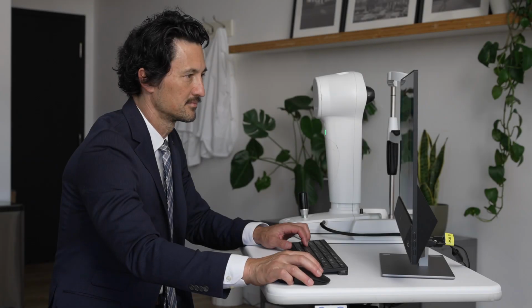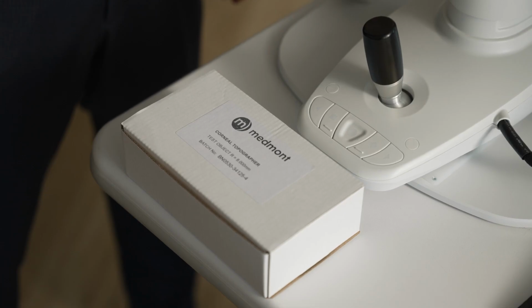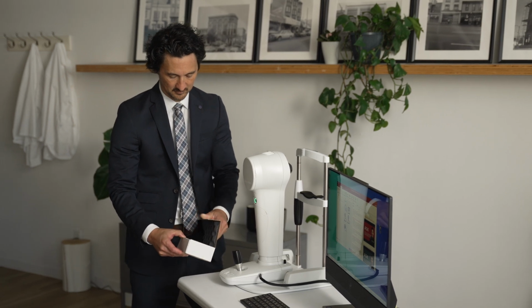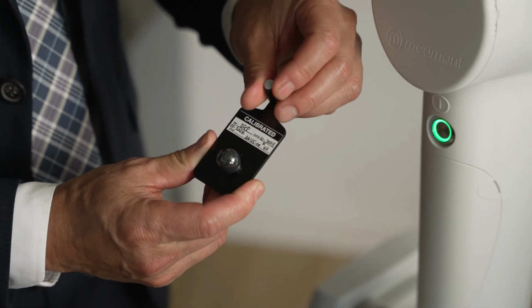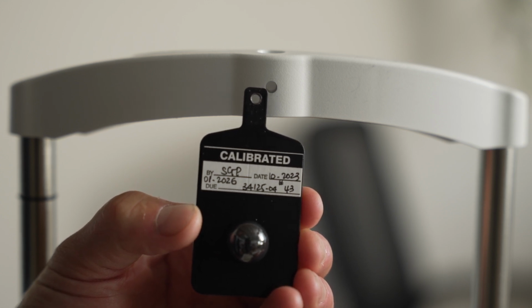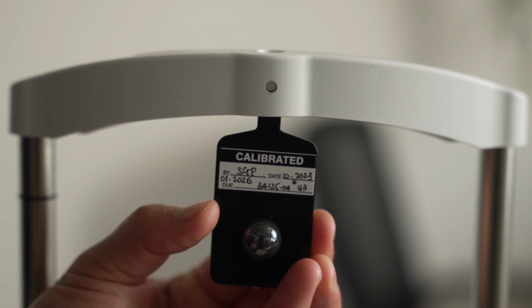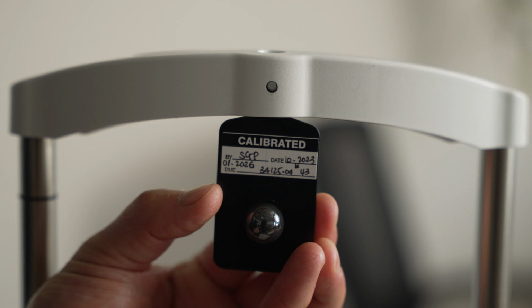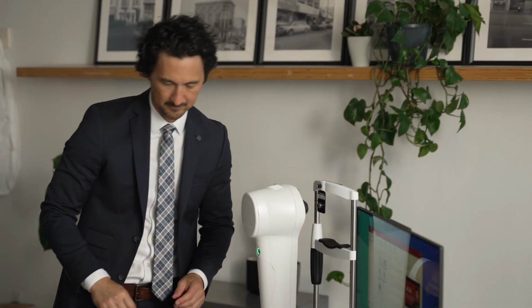Now that you have the software and the Medmont Meridia set up, you will need to calibrate your Medmont Meridia. The calibration ball is located in the small white box which you took out and set aside during the assembly process. Hold the calibration plate by both sides. The calibration stem is not attached to the exterior of the headrest. You will need to insert the stem inside the slot in the patient headrest that holds the calibration ball stem. Make sure that the hole in the headrest and the hole in the calibration stem are aligned. Once aligned, insert the thumb screw and twist to the right to secure it. Now that your calibration ball is attached, it is now time to calibrate your instrument.